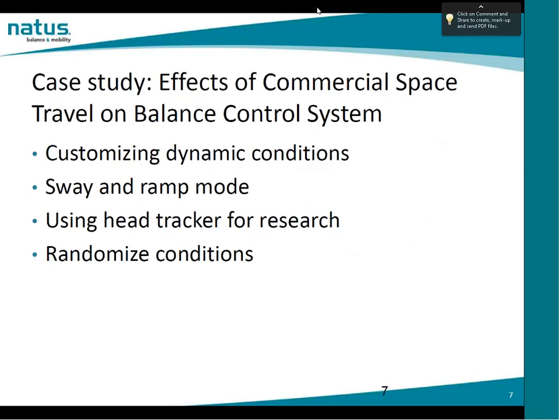Today we're going to be reviewing a case study on the effects of commercial space travel on balance control systems. We're going to be looking at customizing dynamic conditions, sway and ramp mode, using the head tracker for research, and randomized conditions.